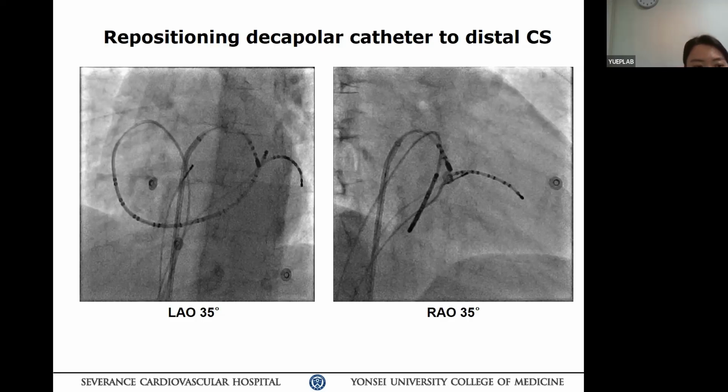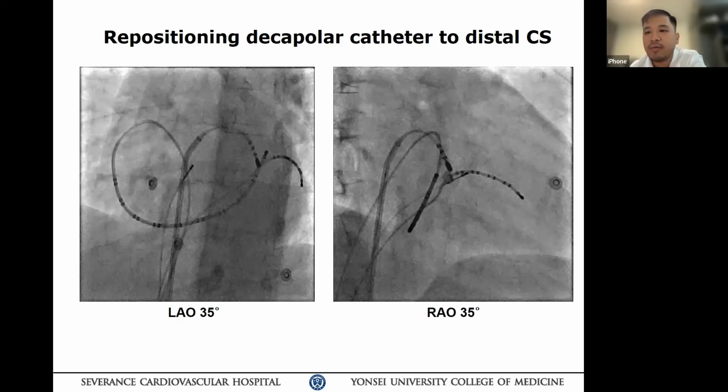Before the first ablation, there was only the accessory pathway tachycardia and the AVNRT was not induced. Only through the accessory pathway, there was eccentric atrial activation to the left lateral accessory pathway. So we did the first ablation to the accessory pathway at the left lateral. So we induced only the first concealed AVRT at first, right? Not the AVRT and AVNRT at the same time. Oh, got it. Thank you.